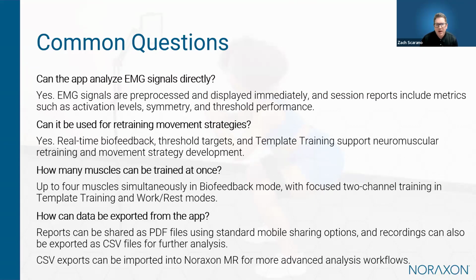The signals in the biofeedback app are pre-processed automatically and displayed immediately, as you saw in the demo. This, of course, allows users to interpret the muscle activation during the session without any additional processing steps.